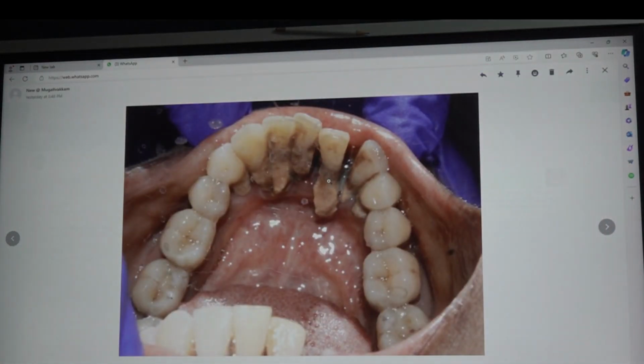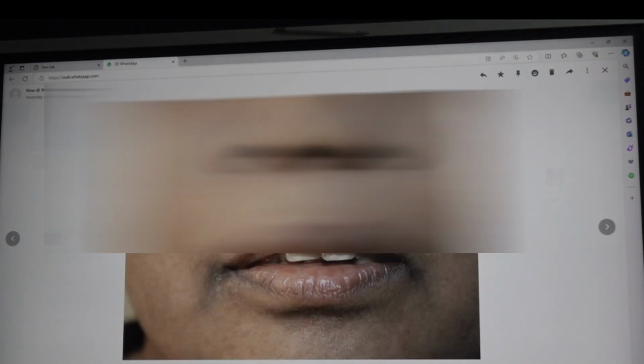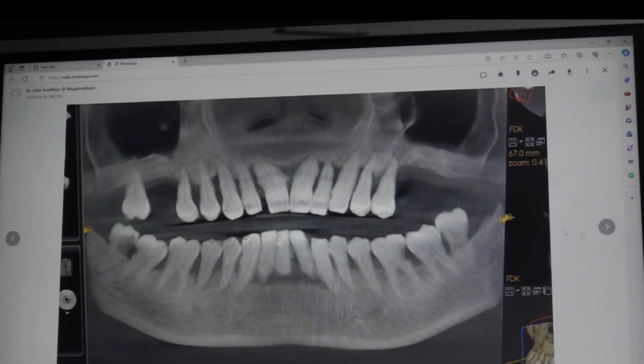The occlusal view is blurred, right? It's not correct. A smile photo, a better one. A smile video, right? Only these two things, and the unplated profile. What is this? Some line? Okay, it is a line. You will see that.